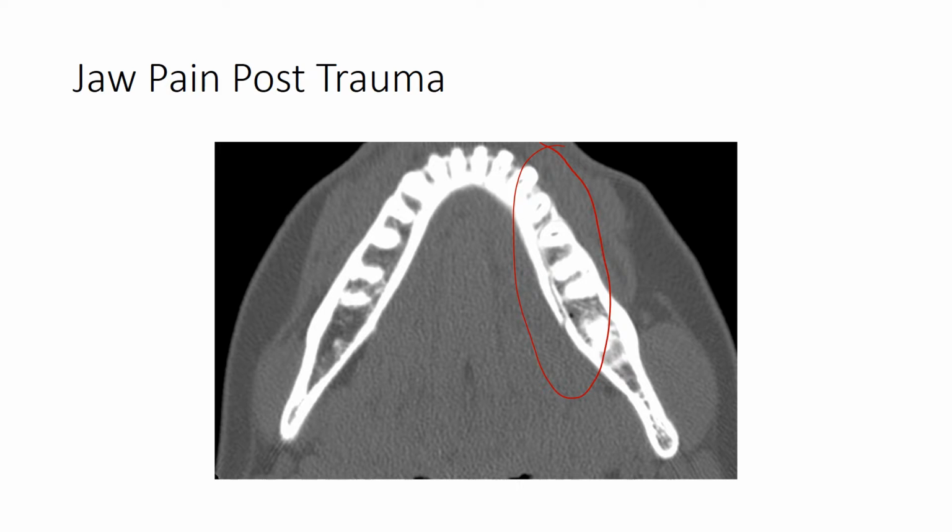But if there's a lot going on, you're busy, there's other fractures that are more obvious, you may overlook this non-displaced fracture here, especially if you've never seen a non-displaced fracture in the mandible. You may be used to seeing very obvious fractures, and this may just slip your attention. So one thing I want to point out is something that will be better shown in soft tissue windows.